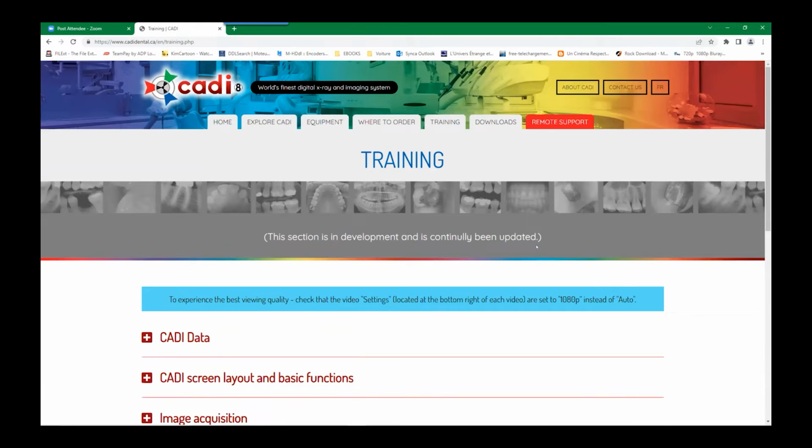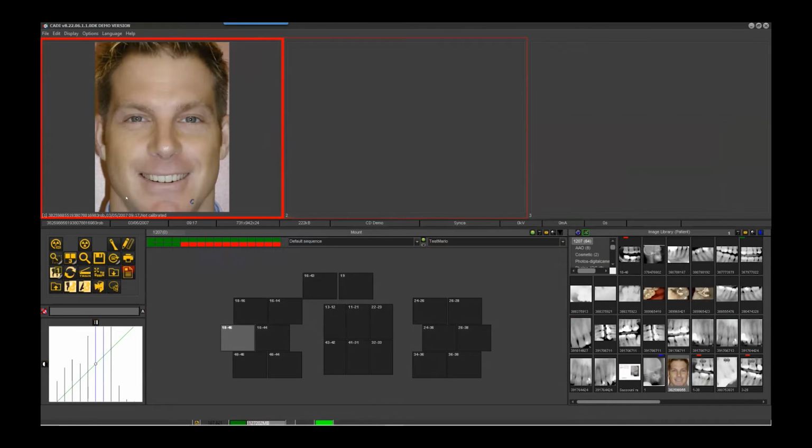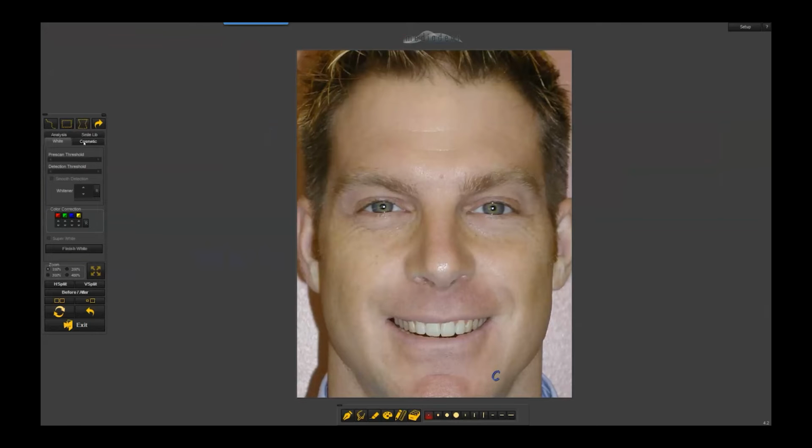Is that where you just showed? That would be like if we were doing veneers, we would take their picture, and then we can create what the veneers are going to look like once we get to the other end. Exactly. You could have an assistant go through, and in about 60 seconds do lengthening, remove gum, close diastemas in about a minute or so, and then if you apply whitening to their teeth, that takes about 20 seconds. It's very quick and fast, and it comes with the software. So it's a module that's built into it that's very popular.